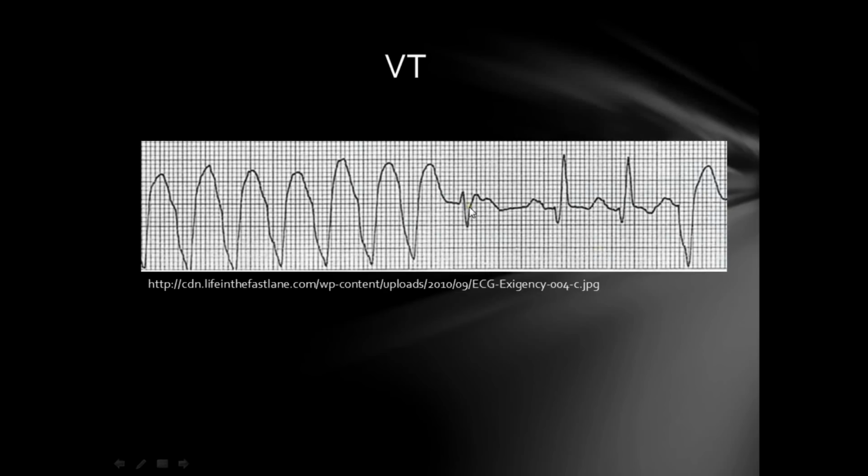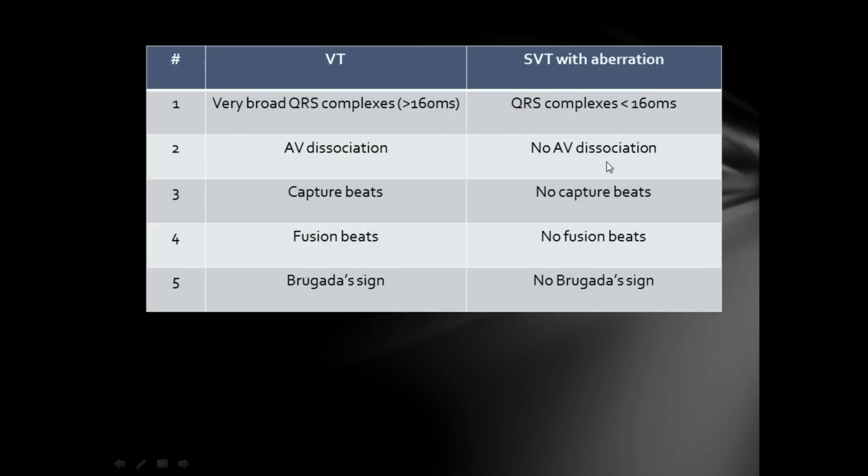And here in this ECG, you can see kind of a hybrid complex. Doesn't look like anything normal. So this is a sinus beat superimposing on the ventricular beat, giving this hybrid complex. And after that, you can see two sinus beats with a normal QRS duration, and therefore these two are capture beats.